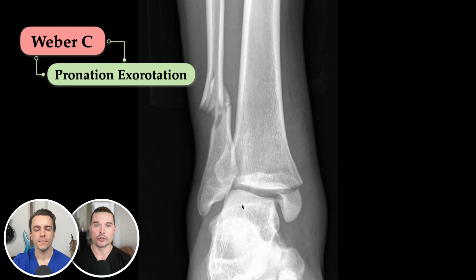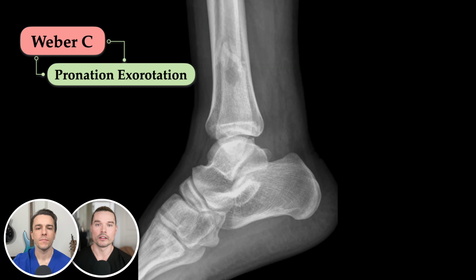Our stage 2 is rupture of our anterior syndesmosis. Our stage 3 is that fracture, which is quite obvious here. And then we should be following up with our lateral and really focusing on that posterior malleolus to see if we see any cortical disruptions, which I do not see, but that does not mean that this is not a stage 4. We could still have rupture of that posterior syndesmosis. So at the very least, this is a Weber C fracture, Lauge-Hansen stage 3 or 4.